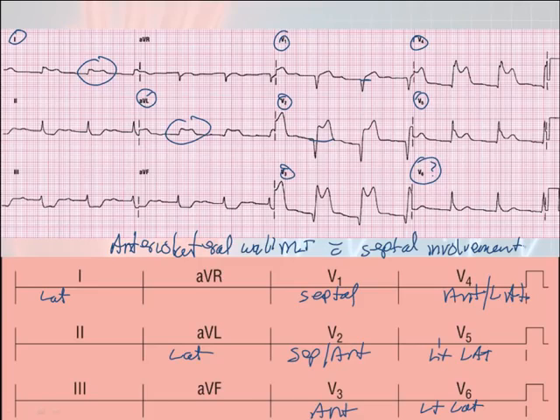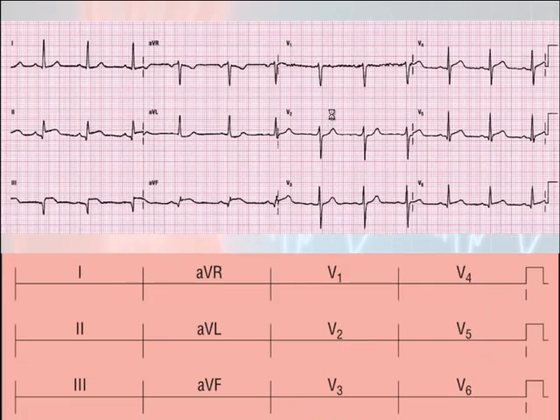My next question I have is, has this person had a heart attack yet? Had a true MI, myocardial infarction yet? Or is this all still ischemia? And regrettably, this right here looks like a pathological Q wave. That right there looks like a pathological Q wave. So it is possible that this person is currently having a true heart attack and not just ischemic tissue. This one is a little bit more subtle, not quite as in-your-face kind of thing.